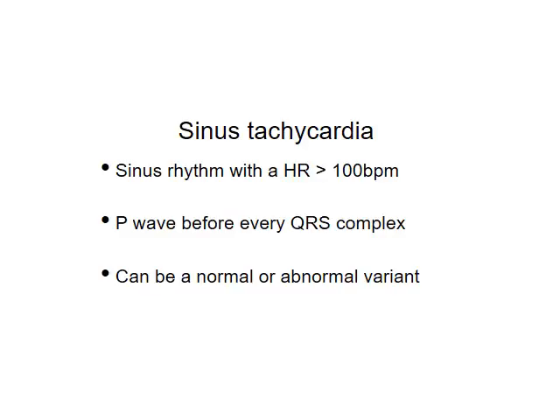So sinus tachycardia will also display all of the features of the sinus rhythm and will have a heart rate of over 100 beats per minute. It can be normal, particularly in an unfit individual, or an abnormal variant, or a response to a physiological insult or pressure.